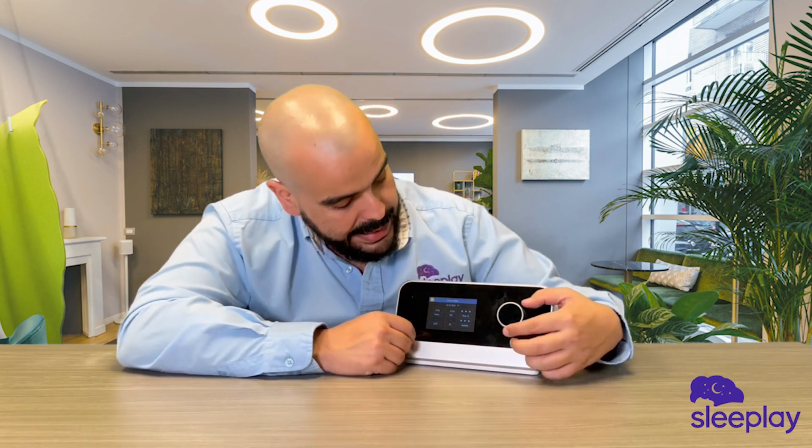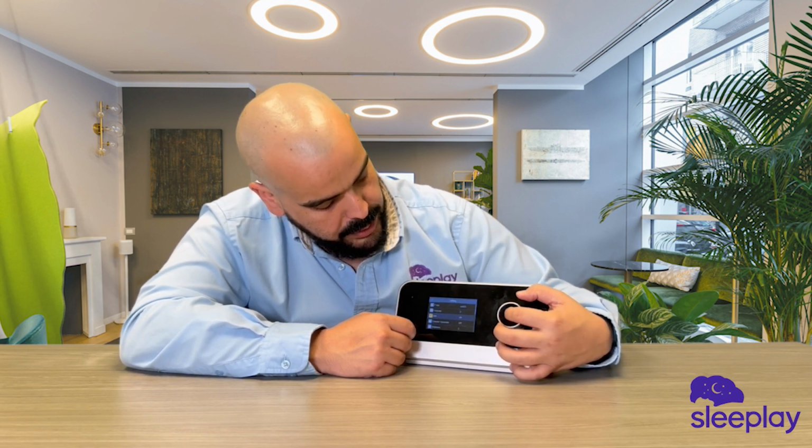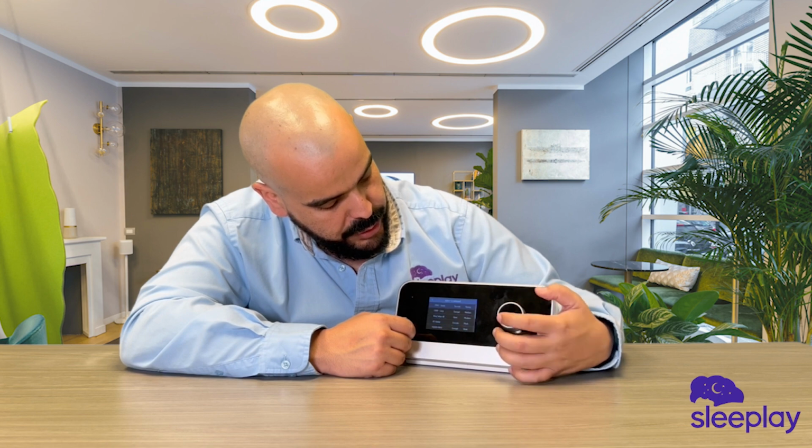I can tell you also with the Wi-Fi, when you're trying to select the Wi-Fi in the settings tab, you're going to go on the Wi-Fi and hit search. Now I will tell you, I had a little bit of connectivity issues with my Wi-Fi too. I did get it to work, but it was a process, and it wasn't working as well as I would have hoped. As far as getting your data, my recommendation off this machine is to just go by your AHI and use the data card. That's always going to be your best option.